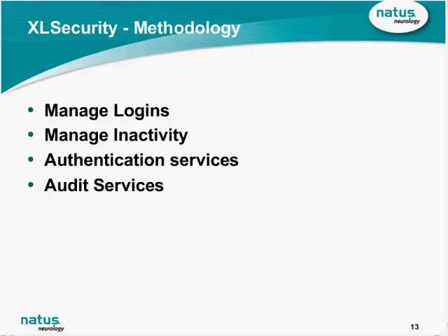XLSecurity also provides you with the ability to deal with an inactive machine. By that I mean if you are on the computer and you're typing some information in, and then for whatever reason you have to leave the room. If you're gone for 20 minutes or half an hour, what happens to your computer? Does your screen still maintain the state that it had previously, perhaps in the middle of typing something in a patient medical record? Should that medical record still be on display after 10 minutes, 15 minutes? With XLSecurity, you can set up rules to manage what we call inactivity.